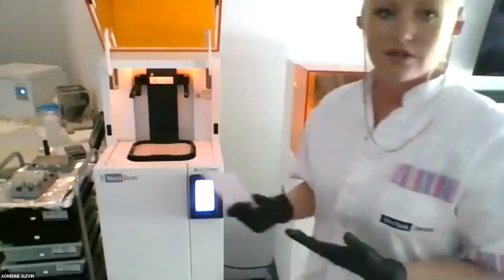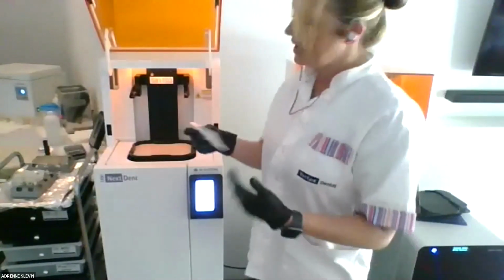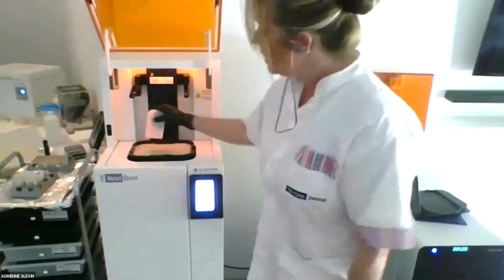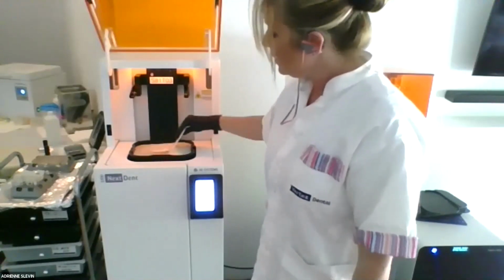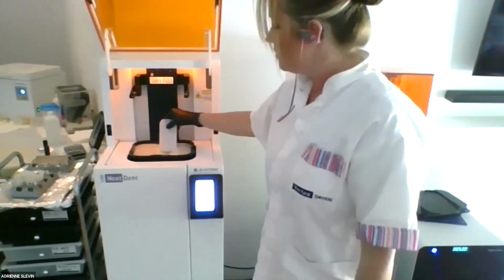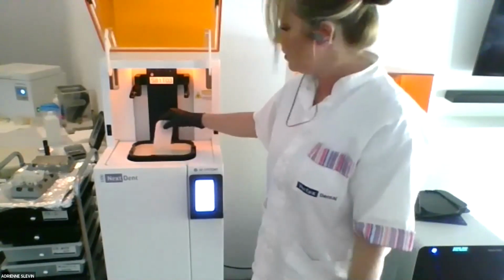What you need to do when you're using ceramic filled resins, and any kind of filled resins, but especially Crown & Bridge MFH, which has ceramic in it and tends to settle, is stir it in the tray. And if you only use 1 or 2 shades, then no problem. You don't need to empty your tray constantly. You can actually leave it in the printer and it won't hurt a thing.